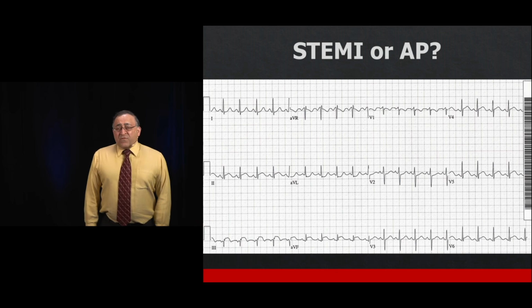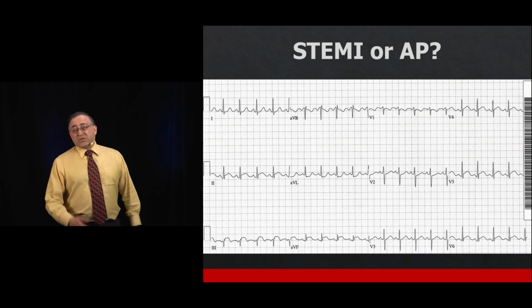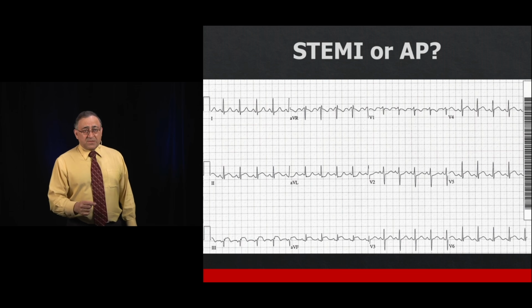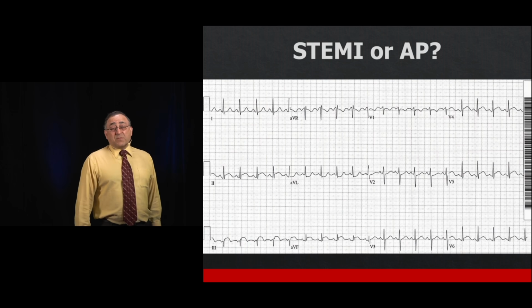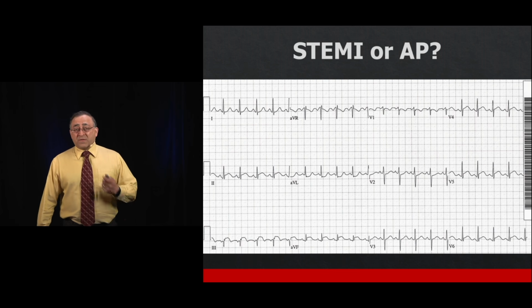So unfortunately, this resulted in a 6-figure payout, and it really shouldn't have been misdiagnosed, but they were misled because the first thing they did was they looked at the PR segments and probably also the computer interpretation. The reason the computer got this wrong is, my guess is computers are probably programmed to look at the PR segments also. The computer has not heard this lecture.